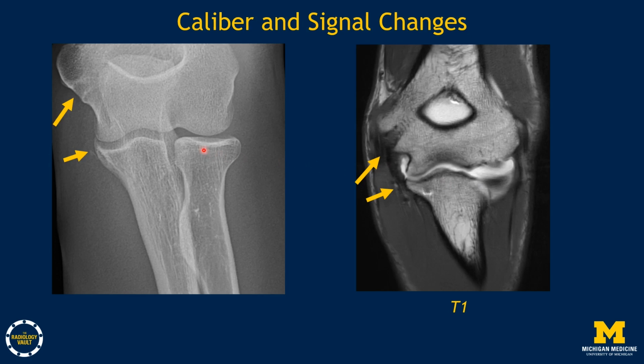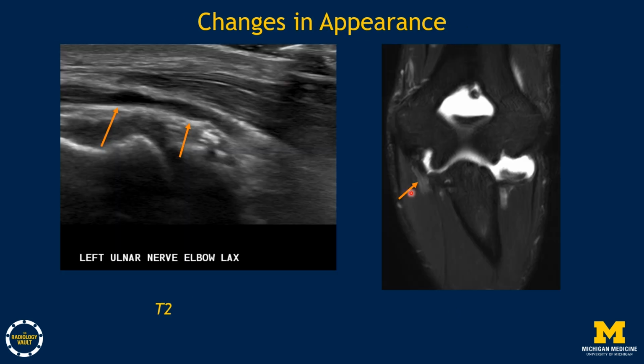More of the same. Here's a patient who had undergone ulnar collateral ligament reconstruction of the elbow. On long axis imaging of the ulnar nerve at the elbow along the ulnar collateral ligament graft, you can see hypoechoic changes with focal constriction in the area of echogenic changes, with swelling proximal and distal to the area of constriction. The echogenic changes are scarring related to the UCL reconstruction.